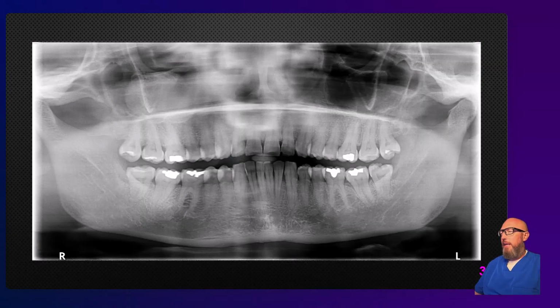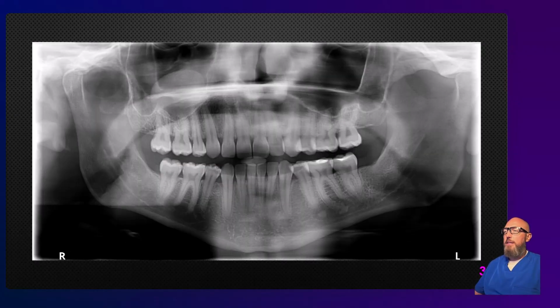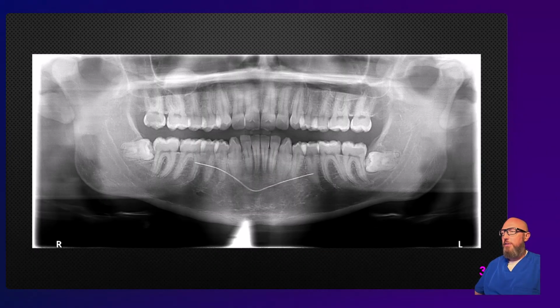Not the best sinus exposure. The hard palate line kind of overlies the sinus floor, but here we see that dome-shaped, well-defined, non-corticated entity in the sinus, and the sinus borders appear normal. This one you can see a little more clearly. Nice and egg-shaped, no effect on sinus borders. It's common for sinus borders to dip down a little bit like this, but no erosion of the borders. So this again is a pseudocyst. All these are examples of antral pseudocysts.